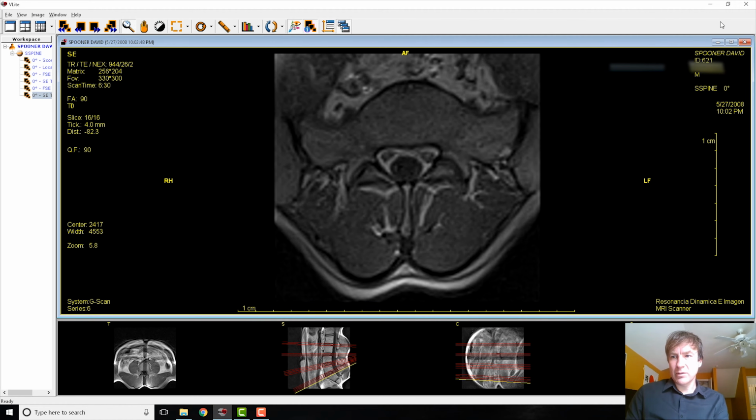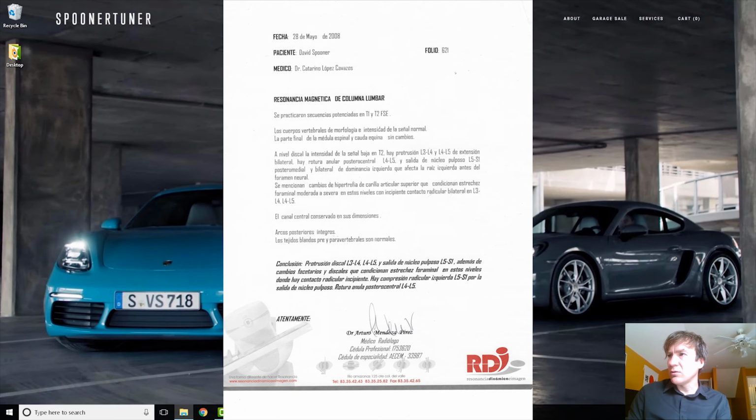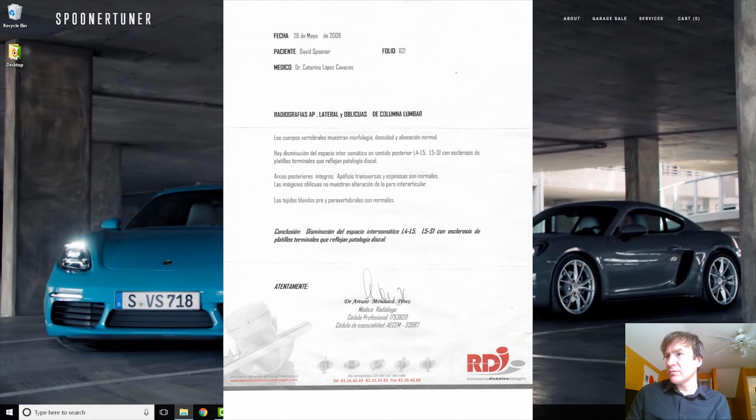Okay, so I'm gonna close this out now, and then we're gonna go to the next one. We're gonna open it up. So give me just a second. While I'm opening it up, you can look at the MRI written report and check that out.